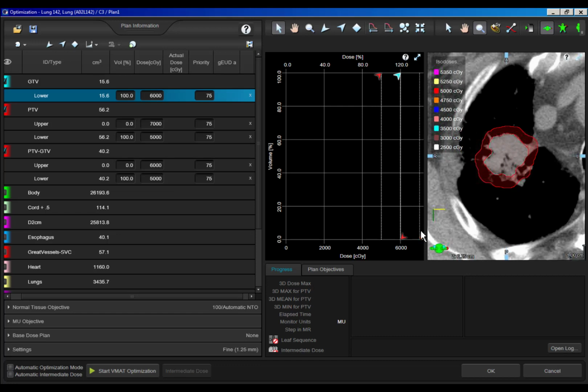And then we're going to push on that ring and our NTO pretty hard. So hopefully our max dose ends up right in the center, right around 7,000. But I'm just trying to control that and make sure it doesn't get lopsided or anything like that. I just want it to be nice and smooth all the way around.